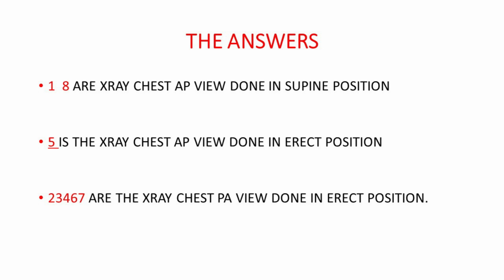The first and 8th, 1 and 8, are X-ray chest AP view done in supine position. The fifth one is the X-ray chest AP view done in erect position. The rest of them, 2, 3, 4, 6, 7, are the X-ray chest PA view done in erect position.